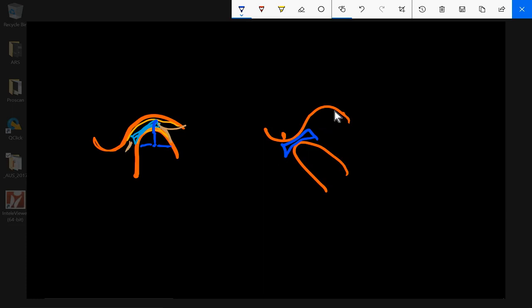Now what if the whole thing is behind there? That is not okay. And you'll see later on that when that happens, it usually stays there, and the patient's mouth is stuck in an open position. That's called an open lock. What happens if there's adhesions and this meniscus doesn't move at all when they open their mouth? It stays in front, something like this.